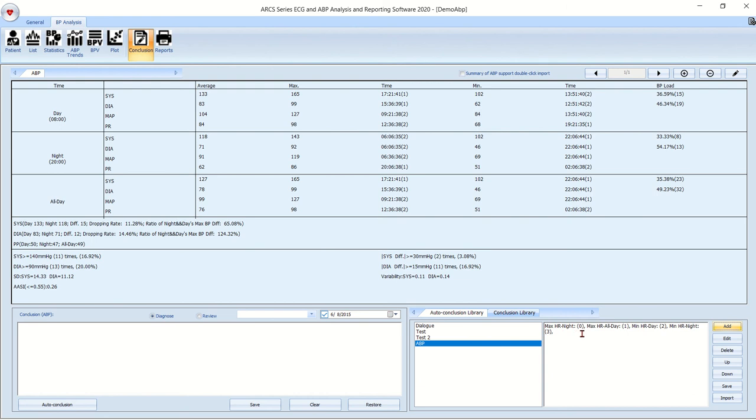So you have each of those parameters that you selected, but they're all zeroed out, and they will fill in when we move them to the right side, and I'll show you how you do that. At the same time, I'd like to show you that you can freehand type in anything you want, leave a space for filling in, and it will keep that. That will now be permanent in this particular book, if you will, until you come back and delete it.